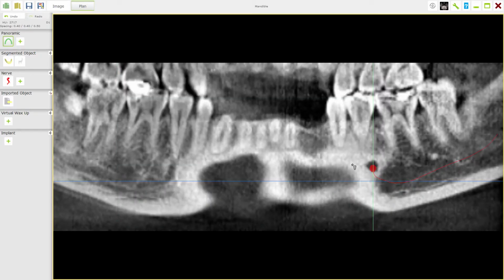So I've selected it. Now obviously when I want it to go in this area here, you can see my cursor has changed to a little implant shape, and I just click roughly in the area, and I get this view of the implant. Now I can move this around, I can twist it left to lean it distally, and it's rotating. You can see around its apex it's pivoting, and you can see the image has changed on the pointer to a little circle, which means I can do that.